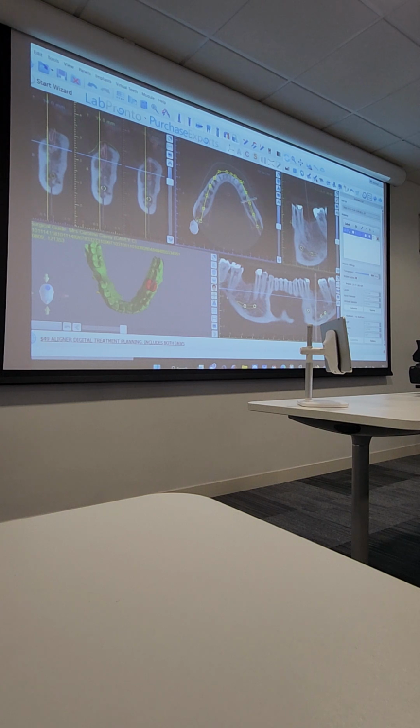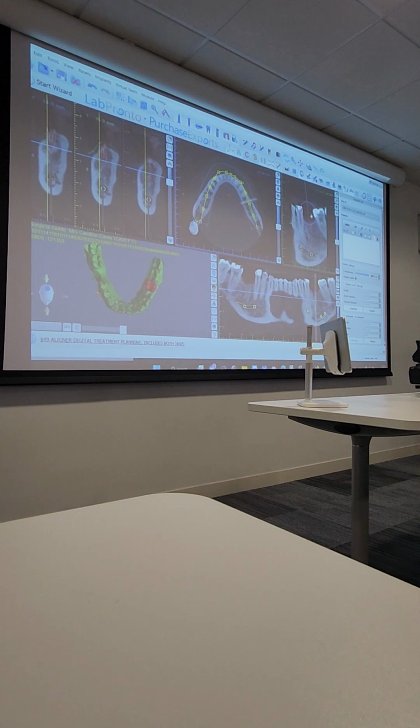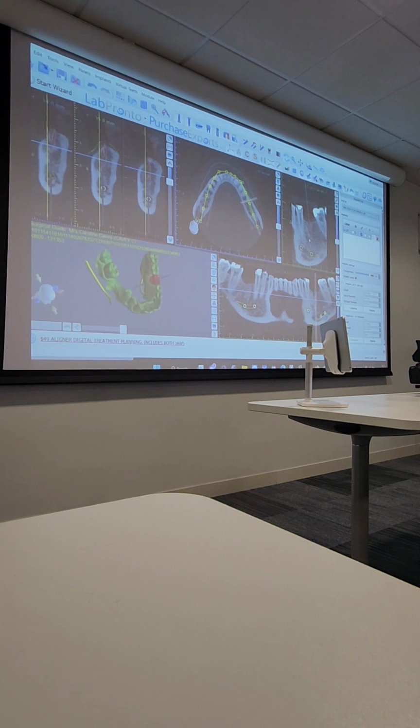Now, I'm going to work in this window, guys. Now I'm working in this window. So I use this window for restoration and adding my implant because that needs to be in relation to your surface anatomy. Now I want to use my information from my DICOM. Now, if I go up and down on this, look at this green triangle here. What's going to happen if I go up and down?